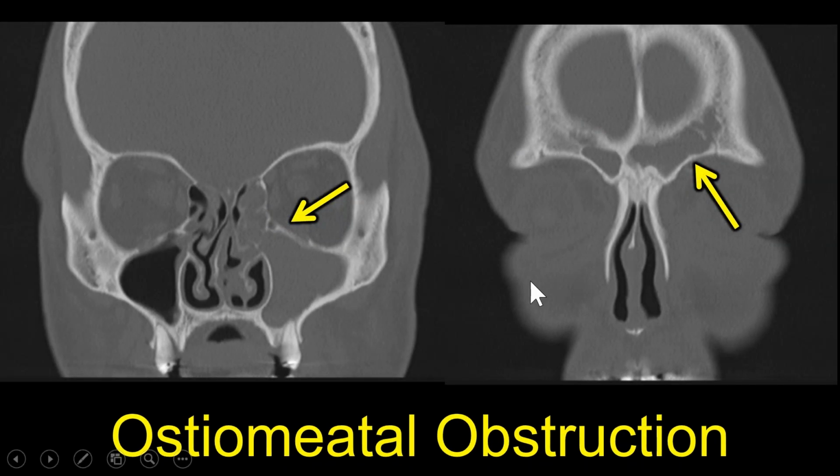Now, one of the things that we think about with sinuses is we're trying to look at the case and think about, is this somebody who may respond to sinus surgery? Is this somebody who needs FESS, functional endoscopic sinus surgery? And in those cases, we think very much about, is there any one particular air cell that looks like it's completely opacified?